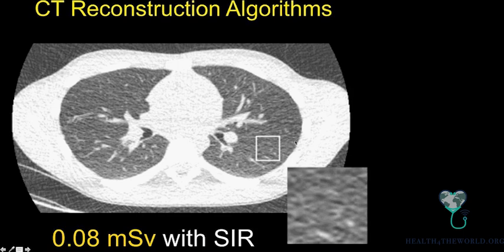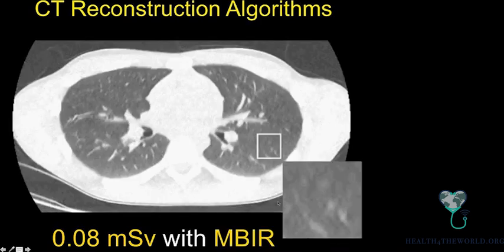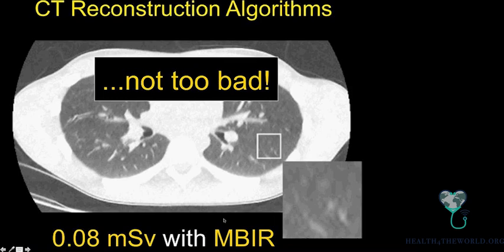And this is where the information is coming from. This is a lung at ultra-low dose, and you can tell even the air is noisy, not just the patient. Are these nodules, are these vessels, just noise? You can't tell. It's too grainy. But now you put on the model-based iterative reconstruction, and oh, this actually was either a fissure or a vessel. The reconstruction method is able to discern better what is reality and what is noise, what is reality and what is artifact. So this is not too bad, and yet we're using such a small dose.